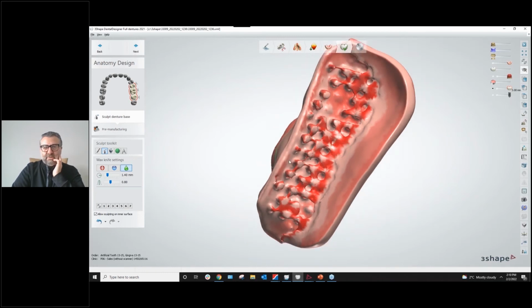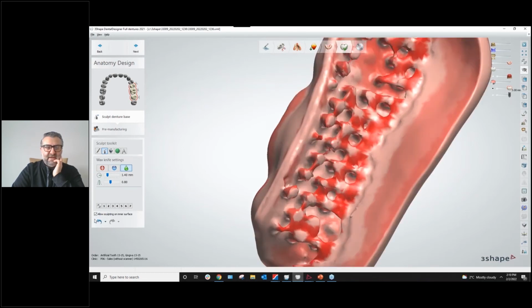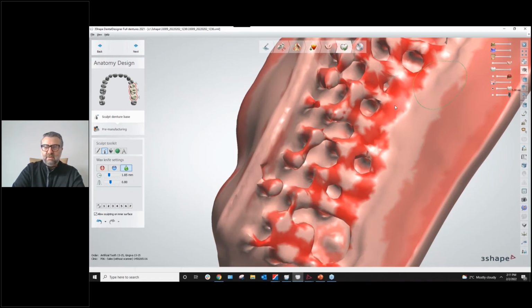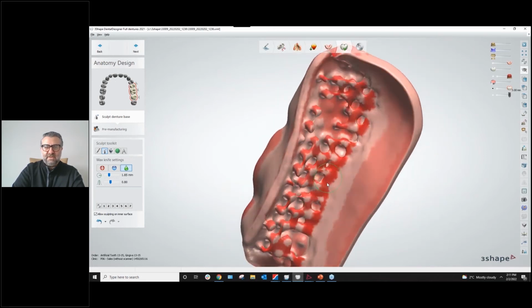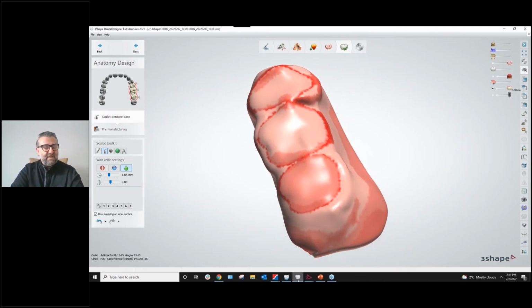And for this particular instance, I would come in and I would just activate my allow sculpting on inner surface right over here on the left side, and just choose my radius and go ahead with just the smoothing feature over here in order to smooth it out and to finalize that way so that I can finish it off with a smoother surface on the internal side. Now, this was just the example of it. Obviously, I have finished it.